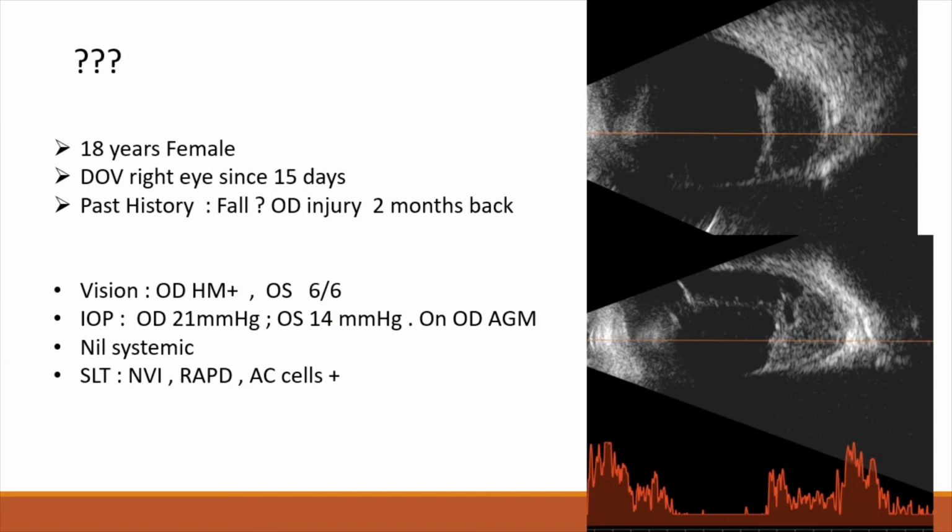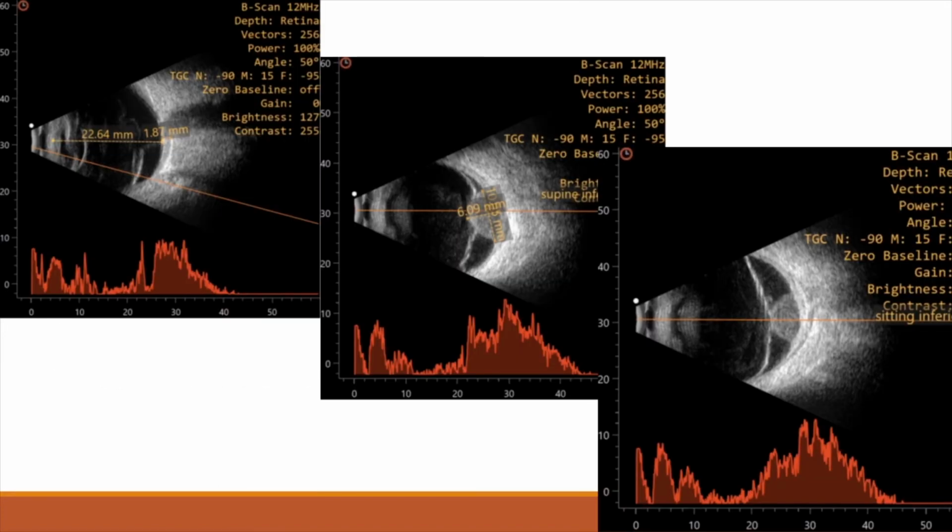Go back to your ultrasound. Yeah. Now can anyone answer the question Charanya was asking? What feature is there that suggests it could be a granuloma? Subtenon space widening. Yeah. Okay, you can see that it's there. A granuloma will not cause backshadowing. It will cause subtenon widening. So you see that under the lesion. Okay?